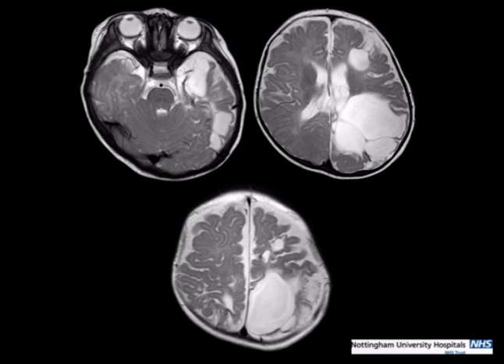But I just wanted to show you just how destructive, even with appropriate treatment, herpes simplex encephalitis can be, and that if you don't raise it and get the treatment started early, then even further damage can ensue.